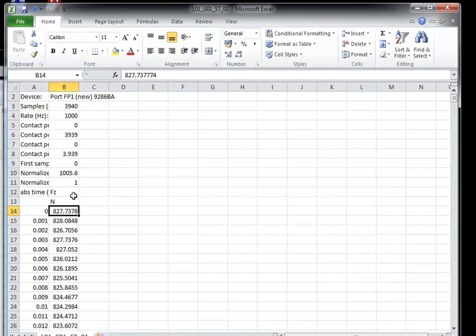It could be from the start to the bottom of the slope, so where the squat starts. It could be over a second, depending on whether we've got a second's worth of data beforehand. It's up to you. Ideally, see what's been done in the literature and what you can take from that to apply to your data. I'm just going to take a random amount today, so I'll look at over the first, say, 20 or 30 frames today, and I'm going to take an average of those 20 to 30 frames.